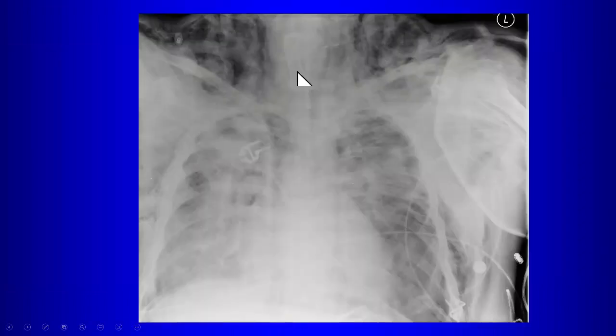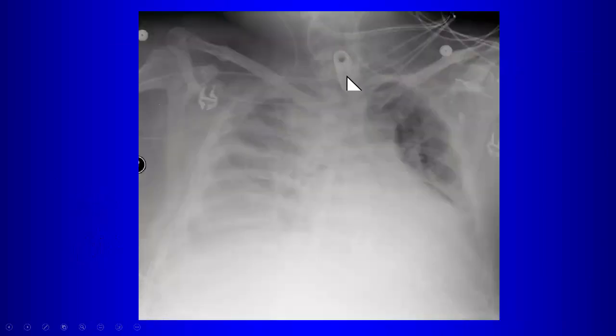Another patient with a massive air leak, this is because the tracheostomy tube got dislodged and was sitting in the subcutaneous soft tissues hooked up to a ventilator. Okay. So that caused a massive air leak. Here when you fix it, that's what it's supposed to look like, without all the excess of air. Okay.